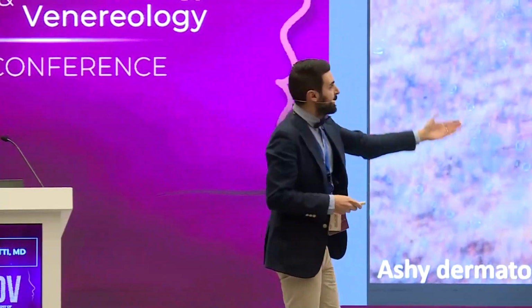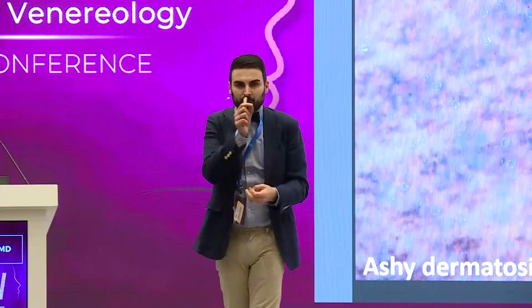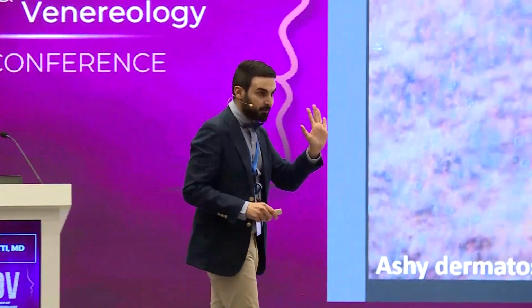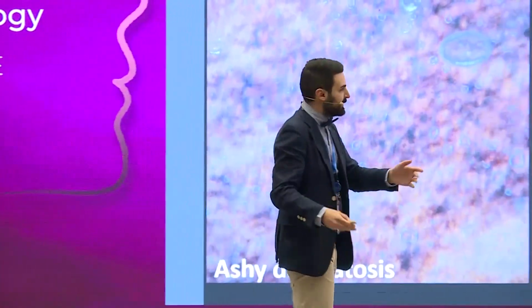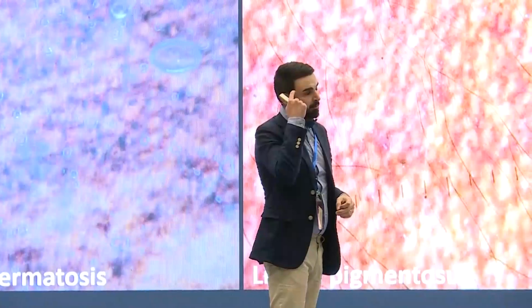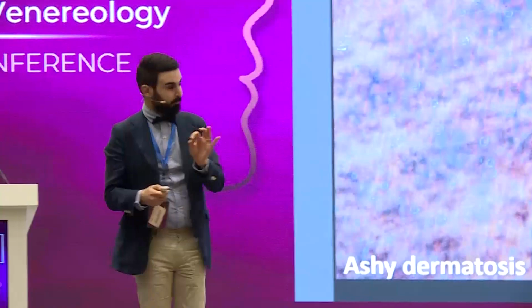Then we have lichen pigmentosus, the same pattern, but the color is brown. So brown dots around the follicles. And third, Riehl melanosis, which is pigmented contact dermatitis. We still have gray, blue, or brown dots around the follicles, but the main clue is the presence of intrafollicular brown dots. Why? We have a pigment leakage through the follicle. So this is the clue.